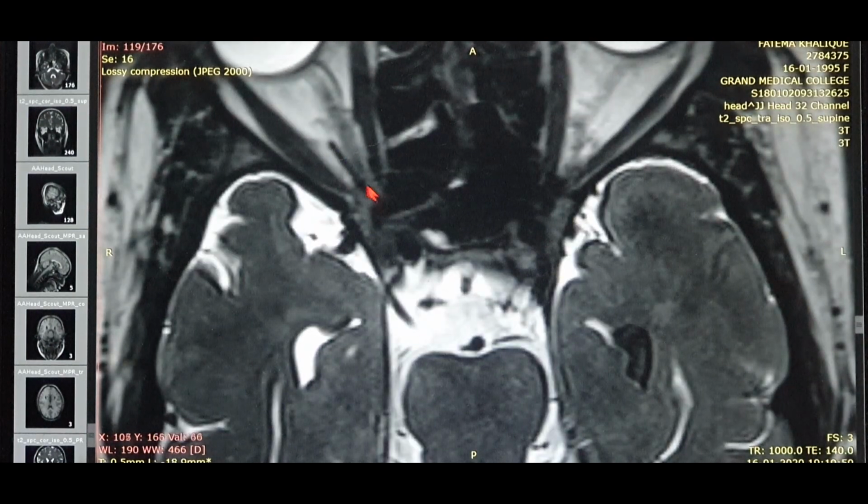You can see that that's the ophthalmic artery right there, from medial to the lateral aspect, and then again it turns to come medially to give off branches like the supraorbital artery. Okay, and then this same ophthalmic artery gives rise to the anterior ethmoidal and the posterior ethmoidal arteries. Okay, so that is the ophthalmic artery.